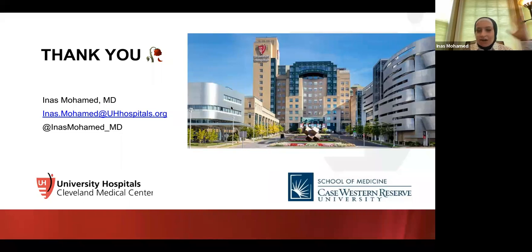Whenever you see a cirrhotic patient, and you know this patient has a history of liver lesion, there is an observation in the liver, it's a must. We have to apply the LIRADS. Same thing when you read the prostate MRI, PIRADS. It's a common language between me and the urologist for how worried I am about this lesion being cancer and what the next follow-up is.